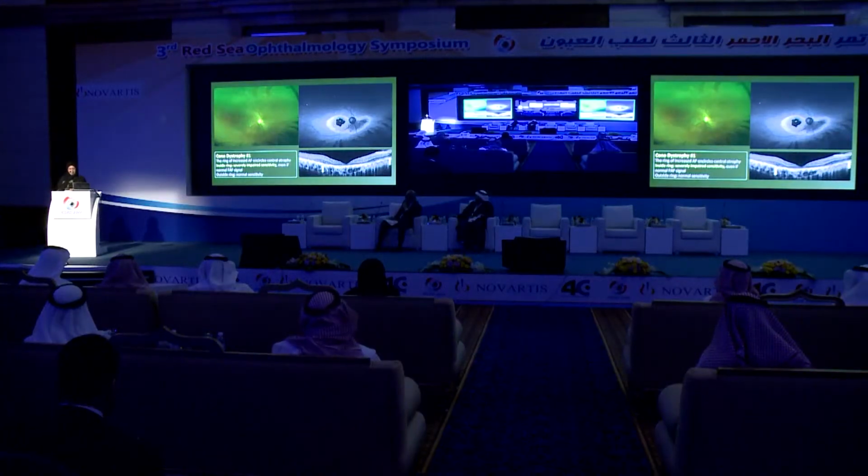And so in this area, in this case, on the right on top, you can notice that the ring is large. Everything inside the ring is hyposensitive. Patients don't see very well, and in the very center, there's a dark area of loss of autofluorescence that corresponds to the geographic atrophy with only a little tiny island of fovea remaining. So you can tell that the patient is very much handicapped. And notice on the OCT how much there is loss of photoreceptor outer segments.